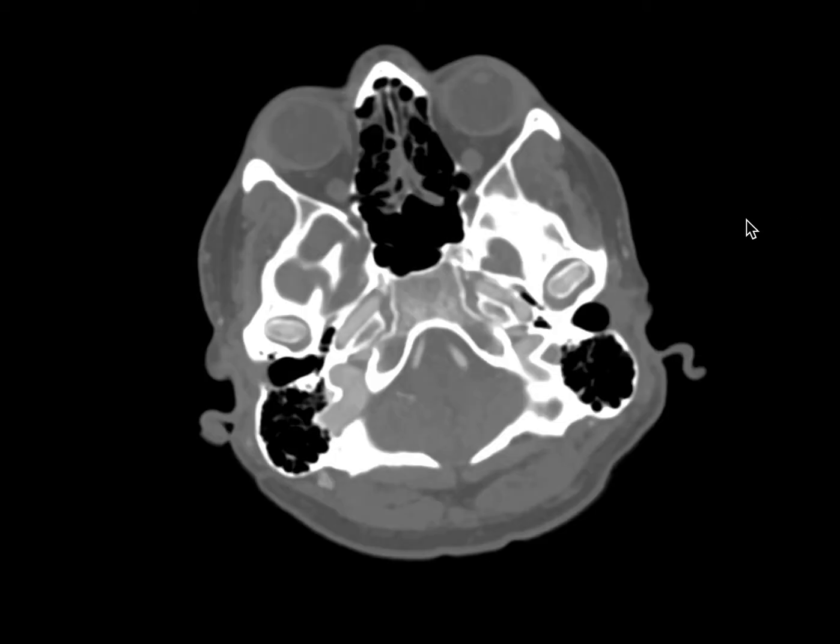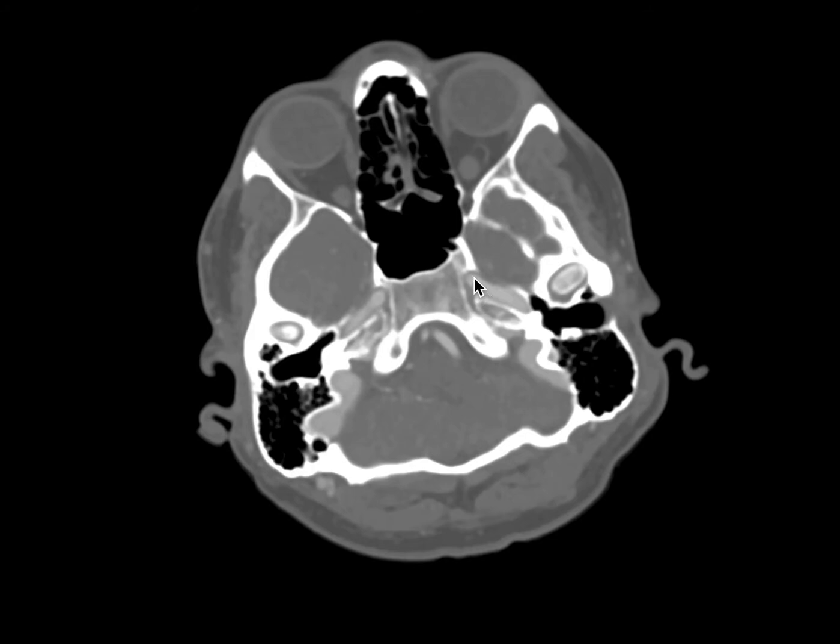We'll continue to follow the course of our internal carotid artery beyond the C2 petrous segment to the posterior margin of the foramen lacerum seen here. This is where our C3 or lacerum segment will begin. It will go over the foramen lacerum. Remember, the foramen lacerum itself is occluded with cartilage.